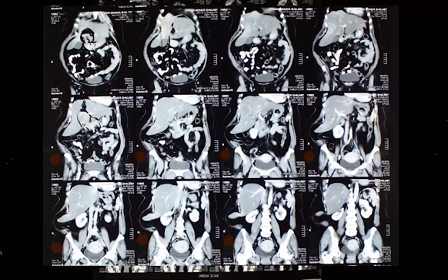And we saw a splenic cyst. If you find an air-fluid level inside the spleen, it is probably a cyst that has become an abscess or an aspirated cyst. So we've seen a simple cyst, a cyst with an air-fluid level, multiple focal lesions of the spleen, probably lymphoma, a ruptured spleen, splenomegaly, and a mosaic appearance of the spleen.